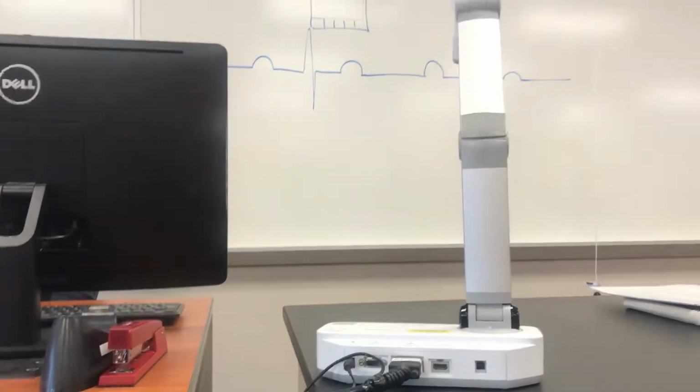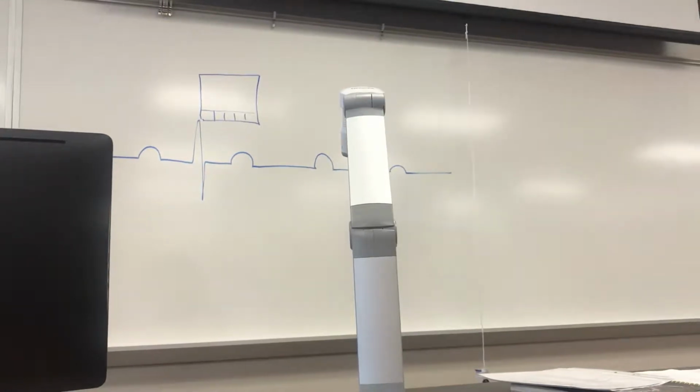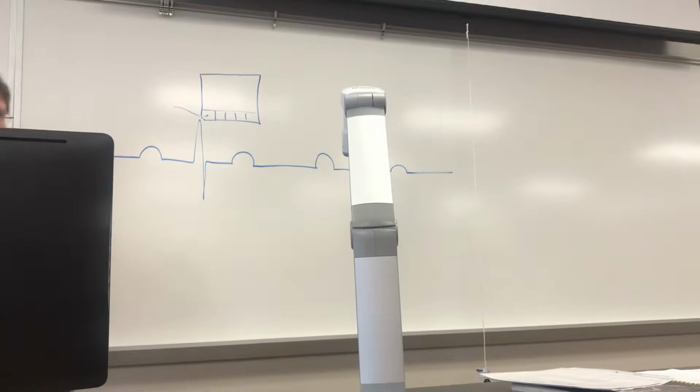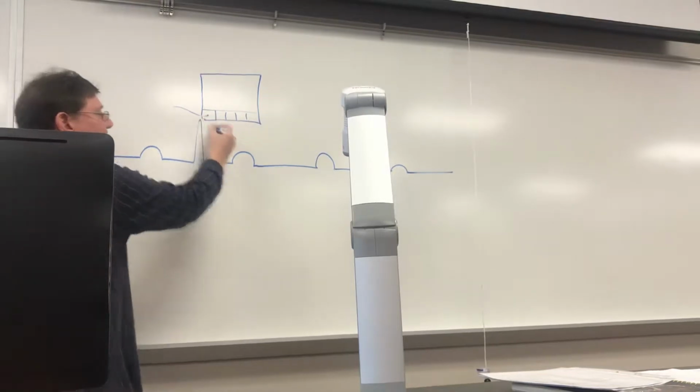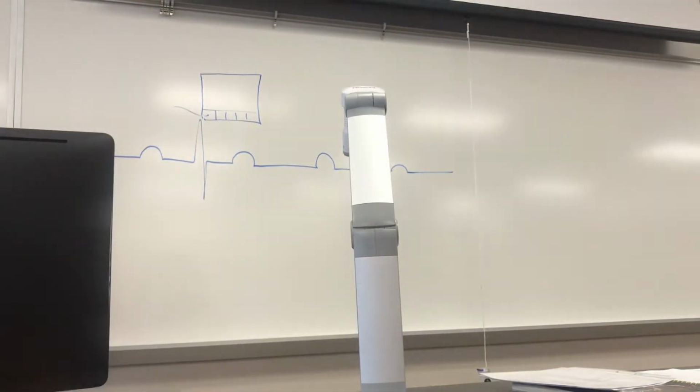Each of the little boxes represents time: 0.04 seconds for every one of these little boxes. So you're going to want to go through and count little boxes from one QRS to the next. You count all the little pink boxes.